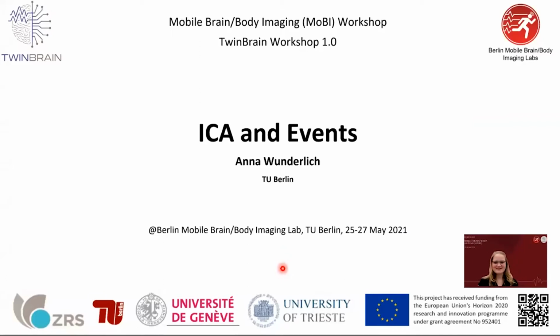Yes, welcome to the next session. I'm happy that you're all still joining this really interesting day with a lot of content. So I'm Anna Wunderlich, and I'm one of the PhD students here at the BMobile, the Berlin Mobile Brain Body Imaging Lab. I have prepared for you 2 sessions. They will be separated by a break. We're going to have 1 hour about the ICA and the interpretation of independent components. And then the second part, we have some events that we can extract from the time series of the independent components.